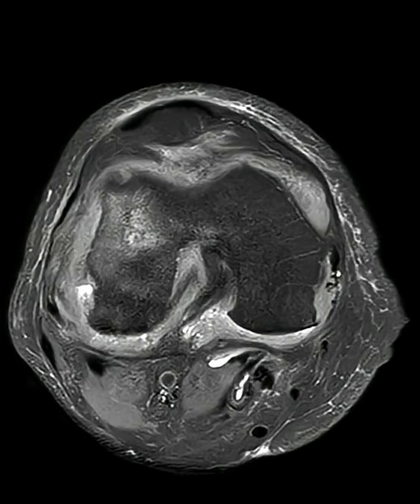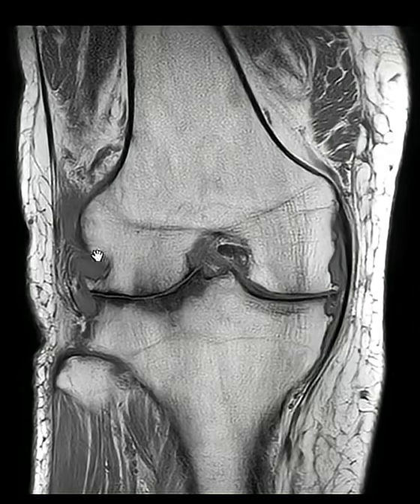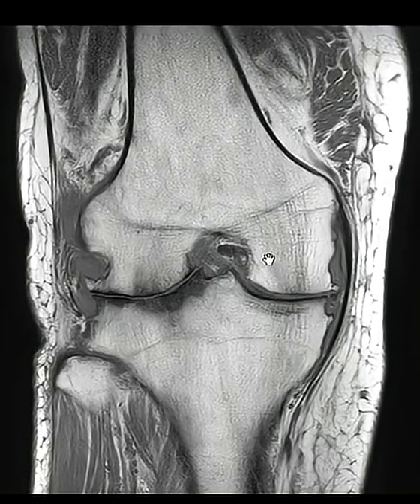It shows up better on this view. So this is a view called a coronal T1 view, and we see what looks like a little bite, like a mouse took a bite out of right here. Also a similar little marginal erosion here. And when we see erosions that are away from the joint, off to the side, especially in a male, we think of gout. So this is probably a case of gout.